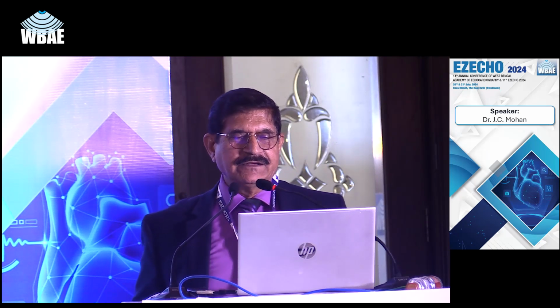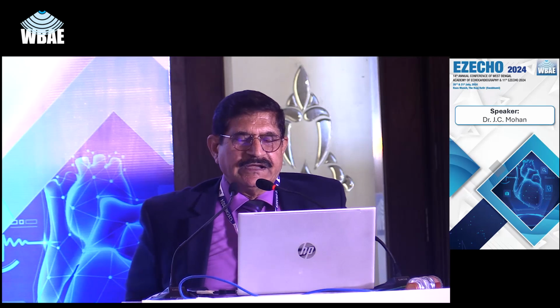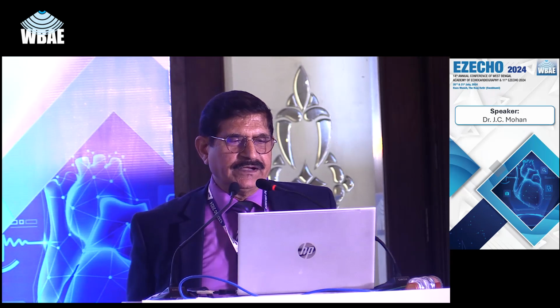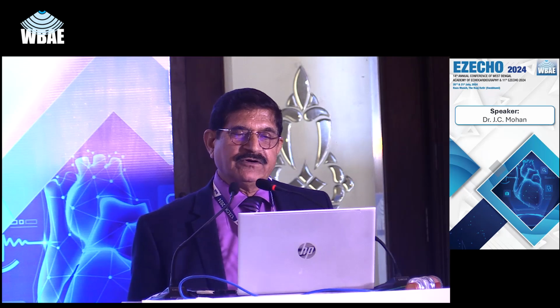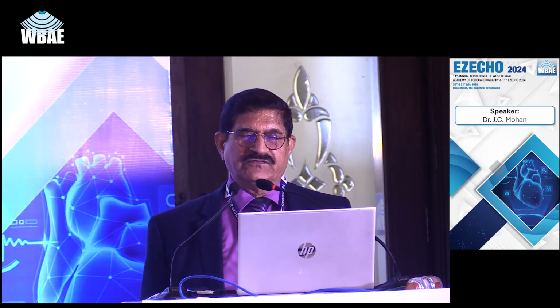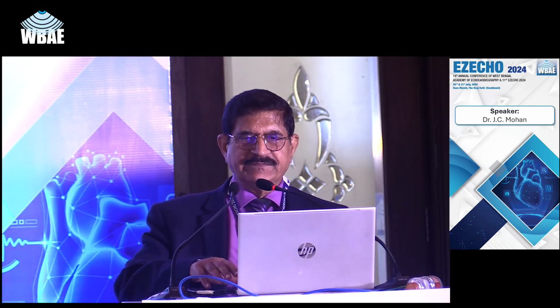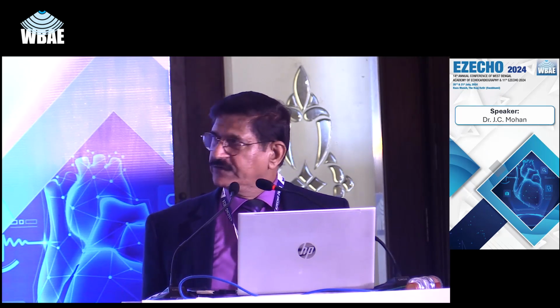Oh, here is the coronal view of the same patient. We are showing you the enlarged left atrium and the left ventricle hypertrophy. You can look at asymmetric septal hypertrophy. The coronaries are normal. And you will see that this hypertrophy actually has very uniform Hounsfield units, about 40, 50, 40, 50 all around. There is pericardial effusion. You can see the pericardial effusion. We'll show you a sagittal view quickly.